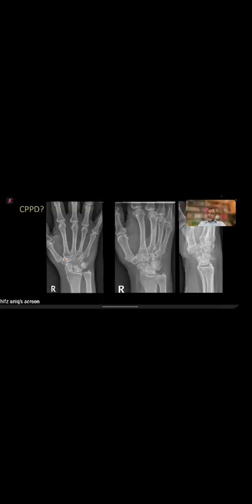So what do you think? How would you confirm? How do you go about it? Patient with wrist pain, we just call it osteoarthritis or CPPD, although treatment is not much different. But the rheumatologist wants to know whether this is something else or this. Yeah, maybe some slack, but not much. So the question is, is this CPPD? Yeah, you can do the elbow, very good.